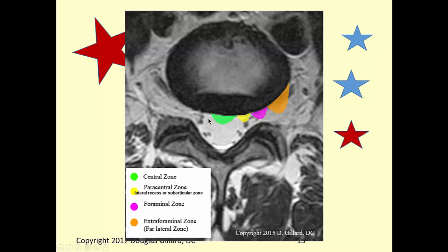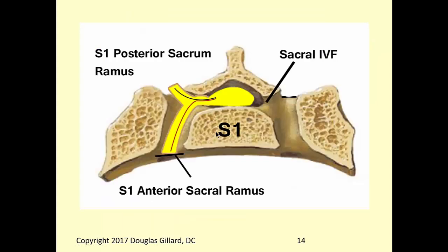In fact, this is a T2 weighted image. It's very high quality. You can even see three components of this nerve root, maybe two motors and a sensory. Here's two components, motor and sensory. If you look closely, you can see the root around it. Within the nerve root, these are the two components. Very important. And remember S1, a little bit different.